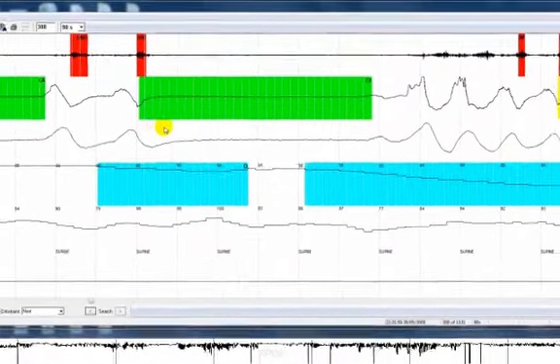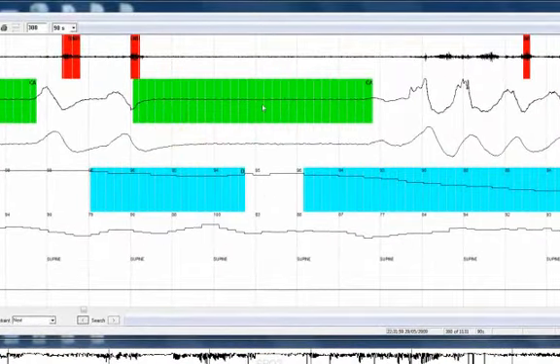In a central apneic event, you have a cessation of airflow, while at the same time you have a cessation of effort. To use the vacuum cleaner analogy again, this would be analogous to pulling the power cord out from the wall on the vacuum cleaner. In other words, you have a central respiratory mechanism shutdown, which means no ventilatory effort shown, while at the same time a cessation of airflow.